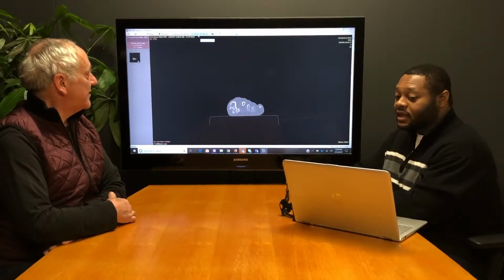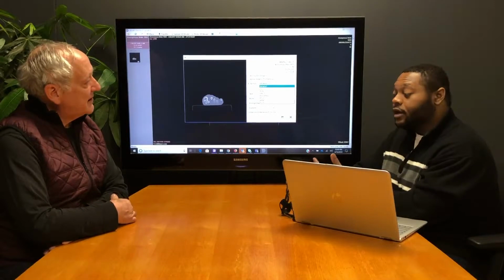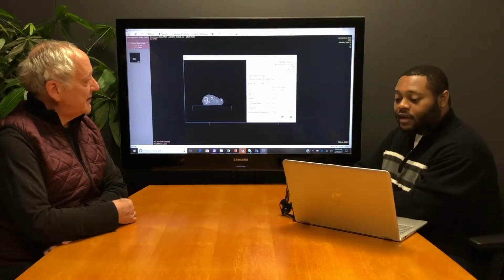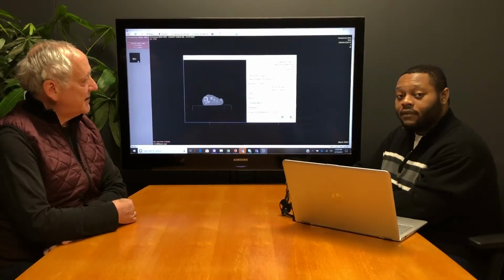We're going to go to the top and select the Order 3D Model button. We're going to go over here and choose whatever body part that we are creating a model from. In our case, it's a foot. We don't want to see the skin, but we do want to see bone and foreign objects, so we're going to turn everything off except for those.